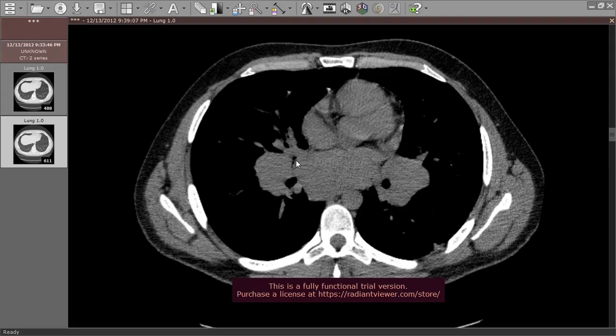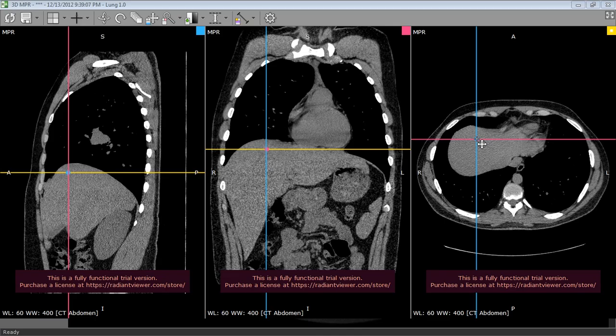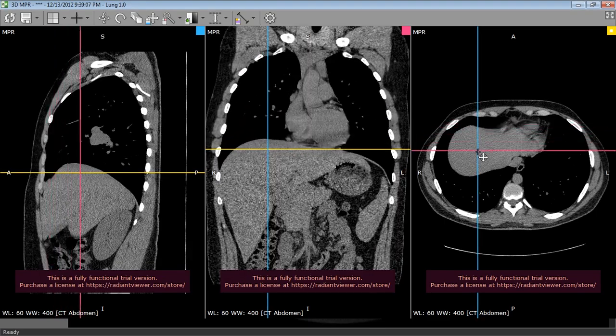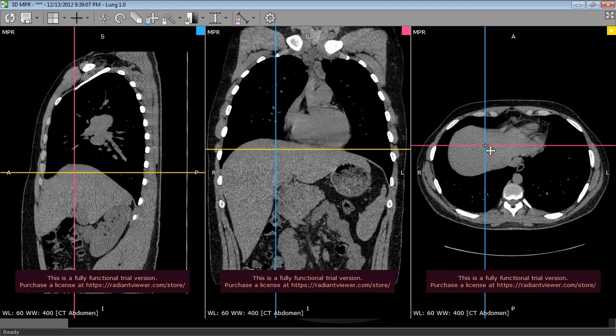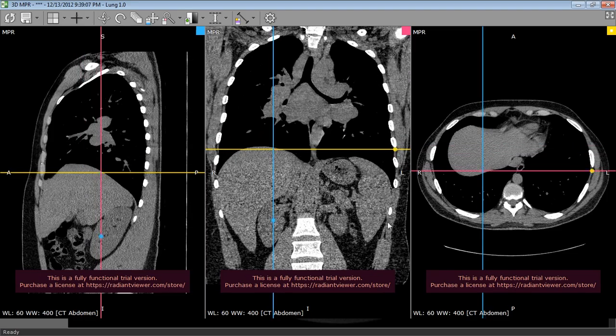The presence of calcification would raise the possibility of sarcoid. What can help also is the size of spleen and liver. Definitely we have hepatomegaly. Also we have splenomegaly. This is more with lymphoma, but it could happen with sarcoid as well.